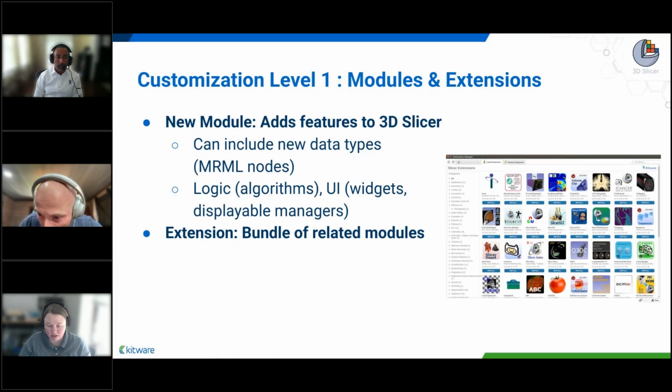So extensions are bundles of modules. A great example here is the Slicer IGT extension, which contains many, many modules that are related to the image-guided therapy tasks that one might want to do with 3D Slicer.